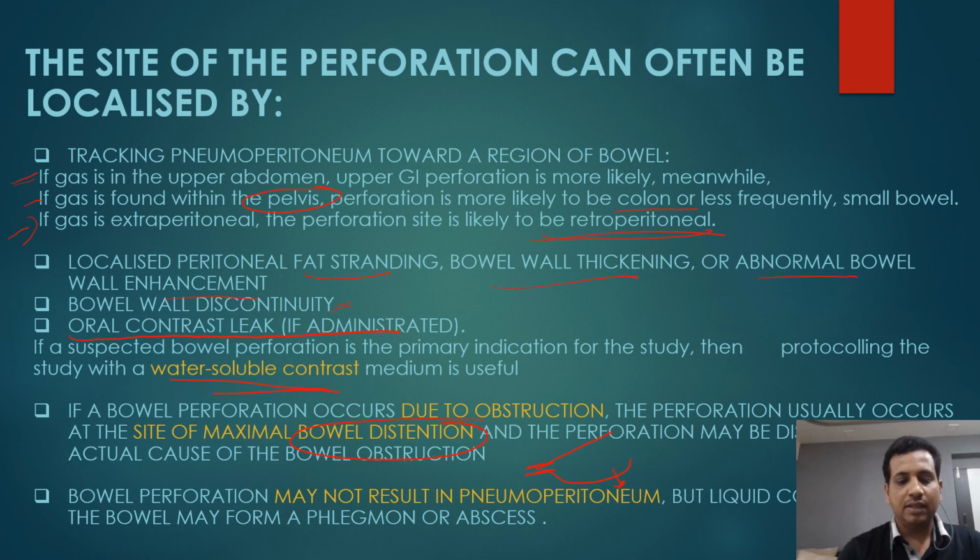And lastly, bowel perforation may not result in pneumoperitoneum in all cases, as we have already seen in sealed up perforation. All around the bowel we can see a collection or a phlegmon or abscess formation without pneumoperitoneum.